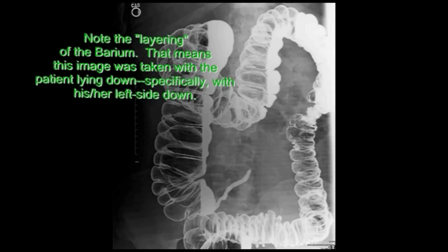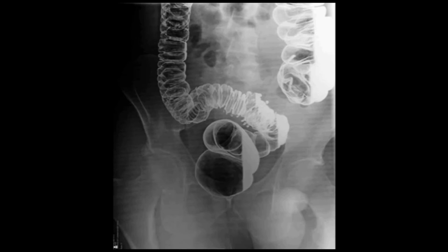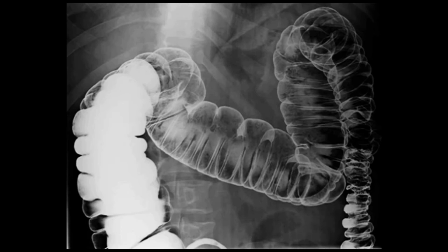A single contrast examination is simply a single column of barium or gastrographin. Gastrographin is a hyperosmolar and iodine-containing substance and can be used for both diagnosis and therapeutic purposes, especially useful in patients suffering from severe constipation. The hyperosmolarity causes explosive diarrhea and can treat the constipation quite effectively.